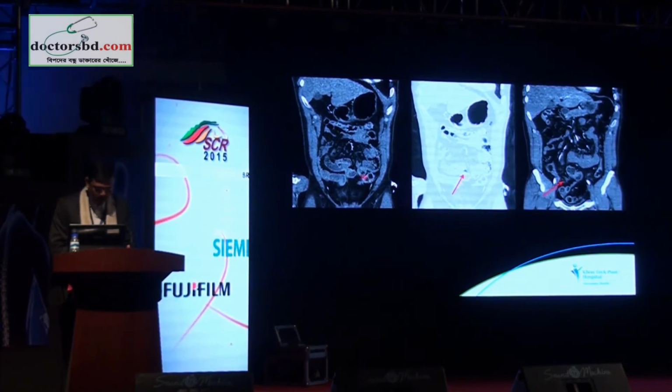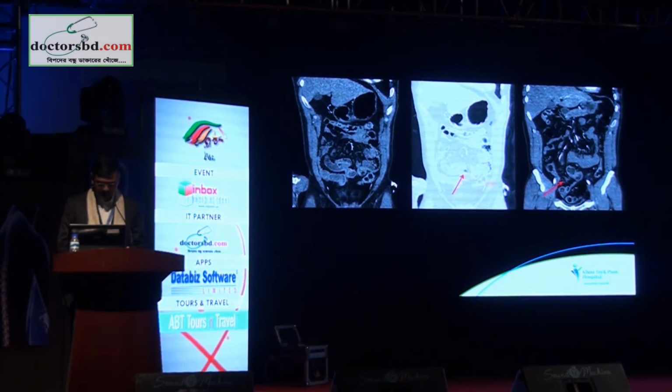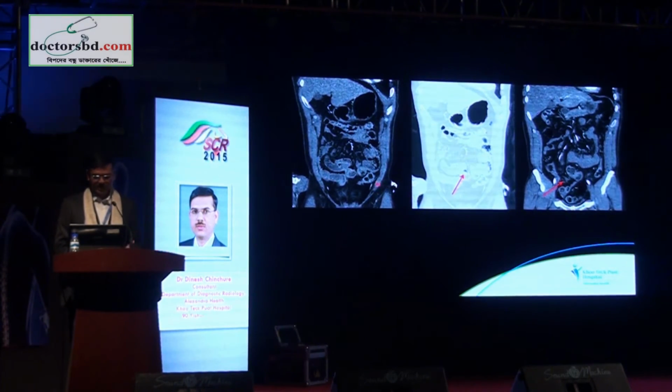You can see that these loops are thickened here, but importance of lung window again. See, there is free air and there is a tear in the mesentery. This was a jejunal perforation because of the mesenteric injury and bowel injury.